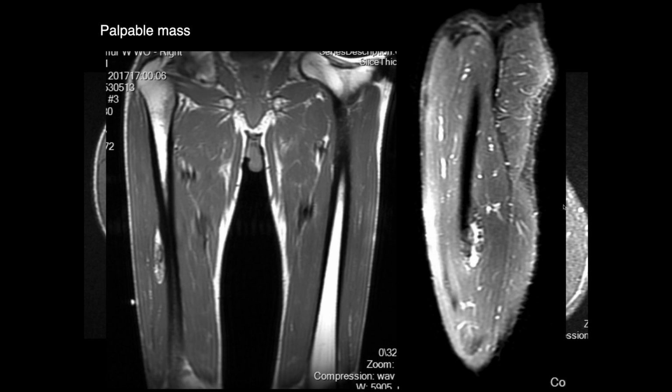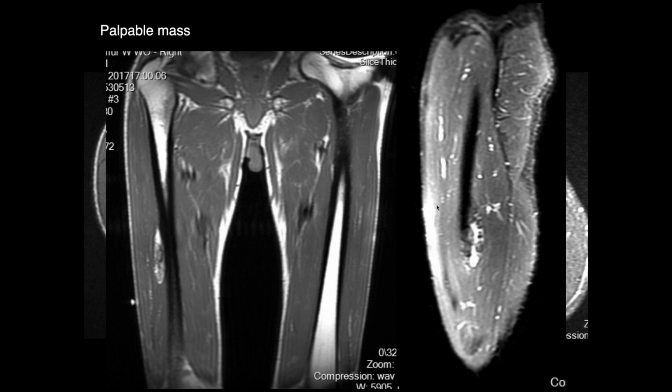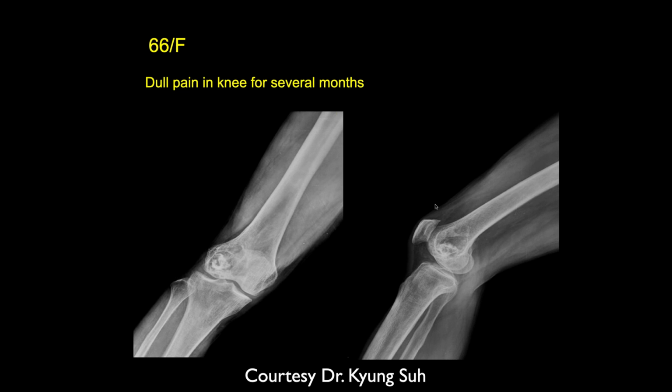It looks pretty well circumscribed, and the adjacent soft tissues don't look that involved. I'm not really sure what has bony and fat within it. Yeah, you think of normal lipomas, liposarcomas. It has bone with it. I don't really see any soft tissue masses except for the fat part. The fat part. It's associated with periosteum. And this is, I haven't heard of that. Okay.